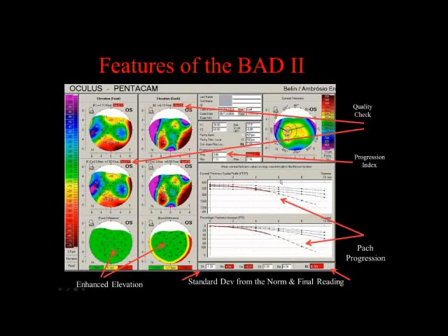Again, this is the corneal thickness map, and you'll notice that if you don't have data on the anterior surface and posterior surface, you can't develop a corneal thickness in that area. And here are the pachymetric progression maps. I also picked this map for another reason, because sometimes, particularly in abnormal eyes, because the patients are so sensitive, no matter what you do, you can't get a full 8 millimeters of coverage. Regardless, you would be able to look at this map and immediately exclude this patient from being normal. In other words, this is clearly an abnormal eye.